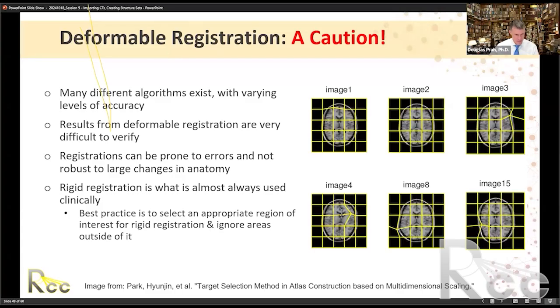So you could have a neighboring voxel, one voxel here gets shifted way over here, and you can see this one's not getting shifted at all. So this will basically just stretch the image out, compressing it in areas. It's very complicated how it does this, but usually it's trying to match densities from the 2 images up and trying to get them to be in alignment.